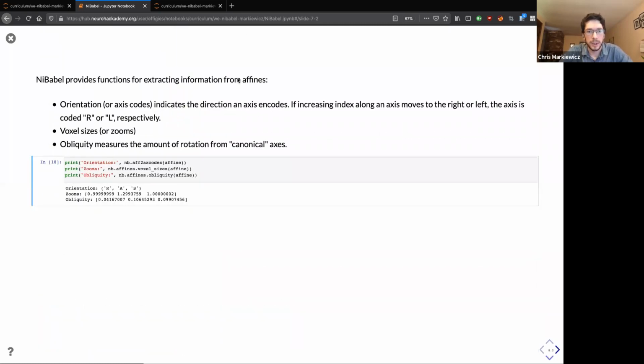Okay, I see a question that's probably appropriate. Why is it named decompose 4x4? Yes, so there is a generic decomposition, and then there's an optimized one for 4x4 matrices. So there, you could also use decompose, and you should get, to within floating point rounding error, identical results.